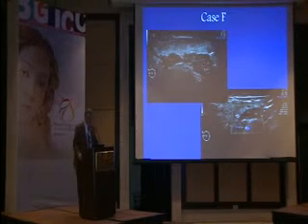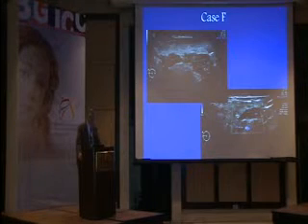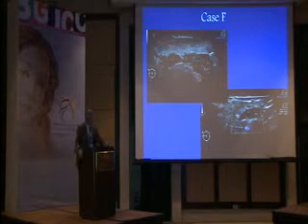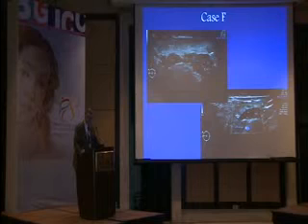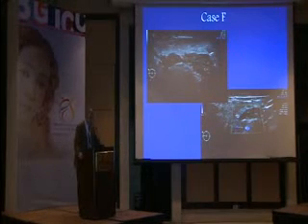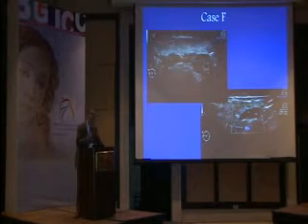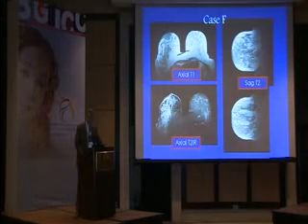And just for a change, start with the ultrasound: a very heterogeneous structure, I would say, and maybe slightly increased vascularity there at the bottom with some complexity of the lesion. MRI, look.